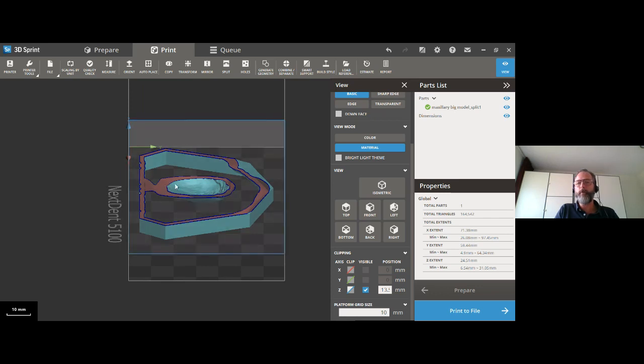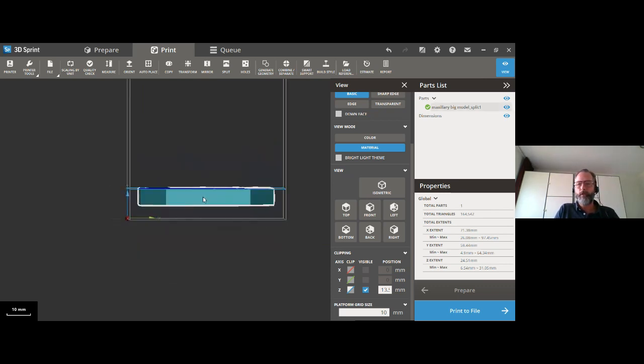What will happen during printing, this is a kind of vacuum cup, and this creates forces, and this might cause slight delamination on the part. And what will happen is that you will print the part and the inside of the palate is really rough, really ugly print lines. Now there is a small trick that you can use.